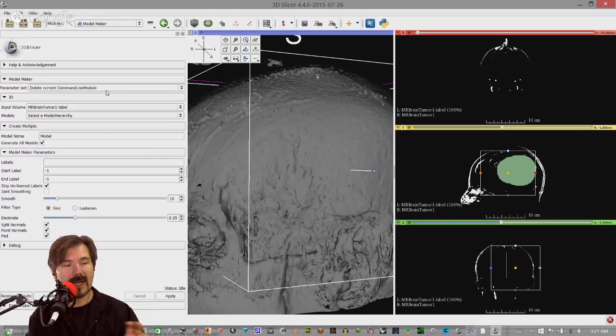So you need to do a fine balance there, and you can look and see the default; I turned it off on this one. But what you'll find if you have too many faces, that really burdens the processor and you spend a lot of time, but you may want that detail. Sometimes you don't need it, so you'll have to play with it.